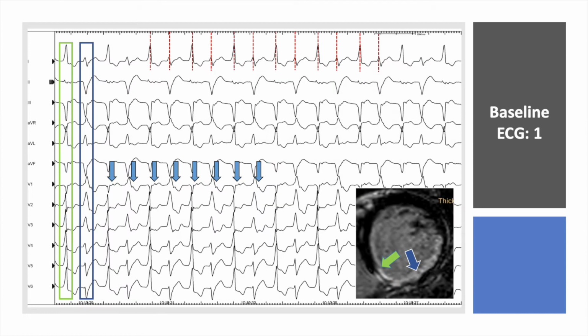This is the original ECG of the patient, which was interpreted as ventricular bigeminy. But if we look closer at the ECG, each QRS complex fulfilled the criteria for a ventricular rhythm. In addition, after each QRS, we can see a retrograde P wave, and therefore this ECG actually shows a ventricular tachycardia. But what is the mechanism of oscillating morphology?